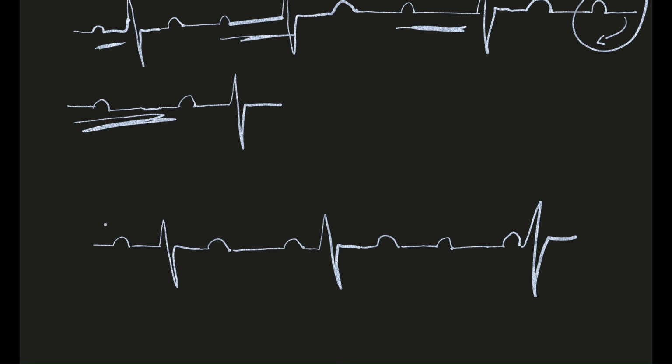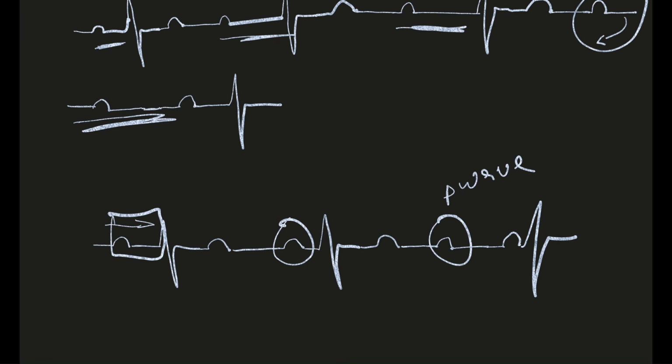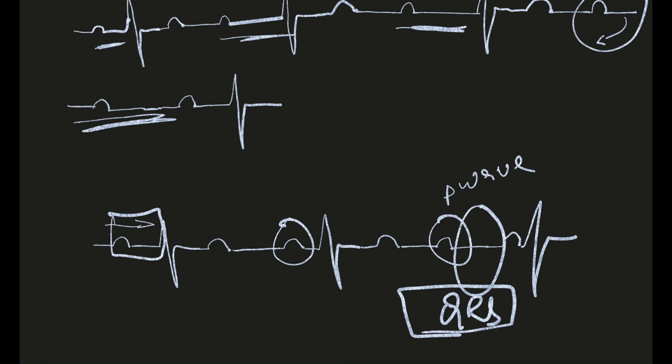There is no progressive lengthening of this PR interval. However, at this P wave, there is a drop of QRS complexes independent of the lengthening of PR interval.